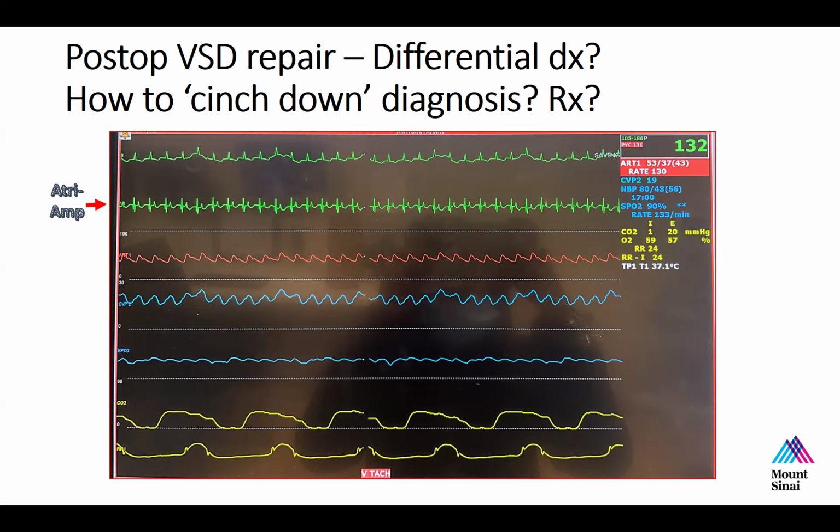What would happen if you atrially pace the patient? So we see the rate of this rhythm is 132 beats per minute. What would happen if you pace the patient at 140 beats per minute from the atrium to the QRS if we were in VT? So you think you're in VT, but you want to prove it. You want to prove that this QRS is not the usual QRS that one would see in conducted rhythm.